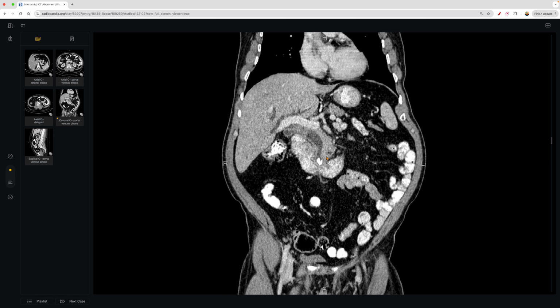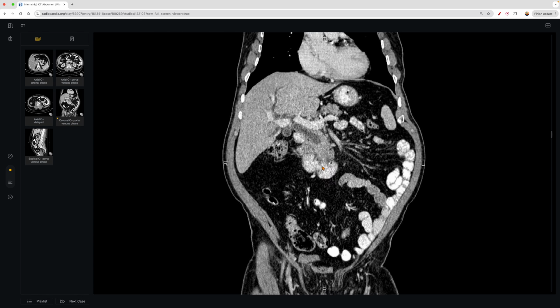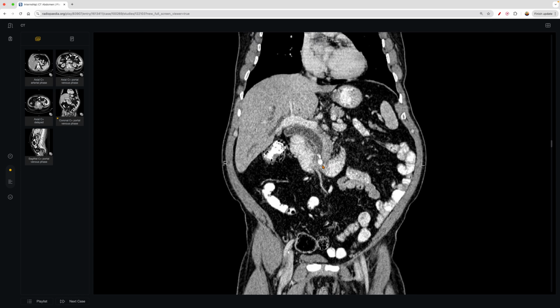I mean, it takes up almost my whole cursor. And typically it's pretty difficult to appreciate. And even in pathologic states, for the cases I had seen, they were never of this caliber. So this is pretty severe in terms of the obstruction. But just know that this is what it would look like in the most severe sense, and it allows you to appreciate the image a bit better. And you can actually see the gallstones and where they're obstructing, right?